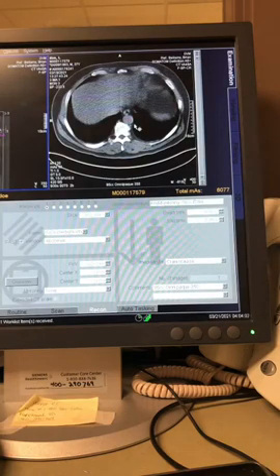So it's just out of arterial. For this one, we need to be specifically in arterial. And there's a couple factors that can go into that. One is gonna be the flow rate, the injection rate. And I failed to mention this previously. On a CT chest with contrast, our injection rate is 3 cc's a second. On the CTA, it's 4, okay? And on the pulmonary embolism, I showed you the P3T protocol, and it can vary per patient and size. So on this one, the CTA of the aorta, we are going to inject at 4 cc's a second with Omnipaque 350. But we're still bolus tracking here.